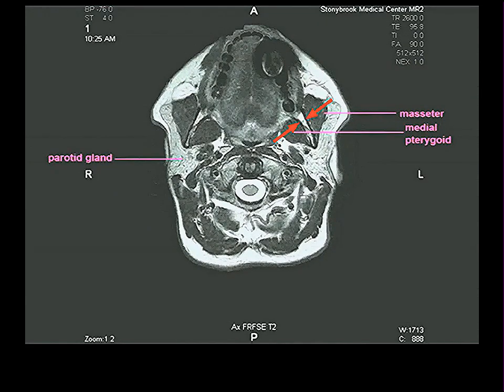First, I want to point out to you this black stripe right here, and here's one there with some white in between. That's our mandible. Again, bones don't appear white in MR. They appear black. The whiteness we see here is, in fact, the fat in the fatty marrow of the mandible. The actual bone of the mandible is this black thing here and this black thing there. And on the right side, it's this and that. So we're looking at a muscle on the outside of the ramus of the mandible and a muscle on the inside of the ramus of the mandible near and attaching to them, and that's what these clearly are.